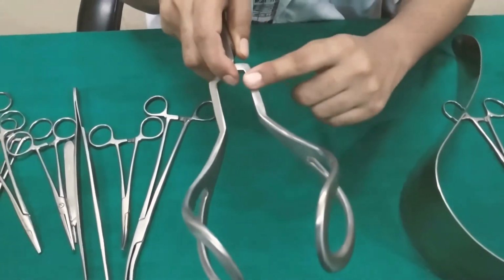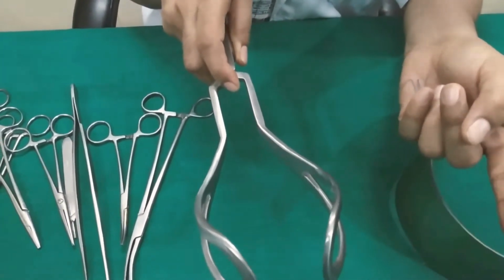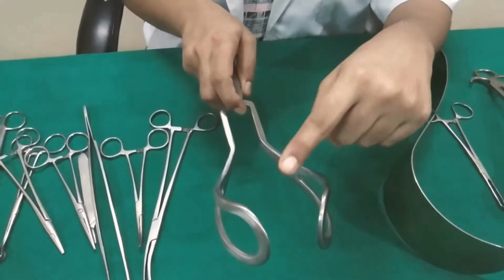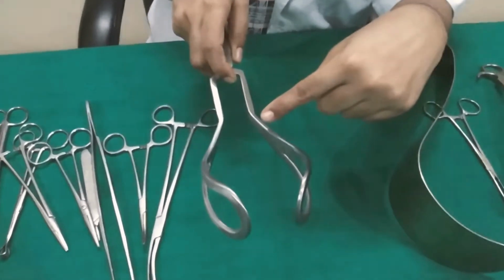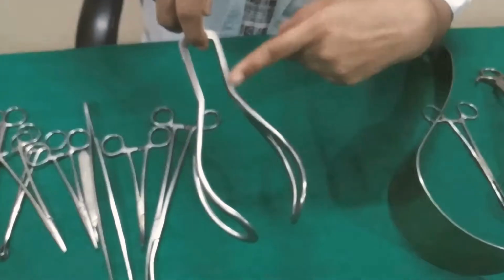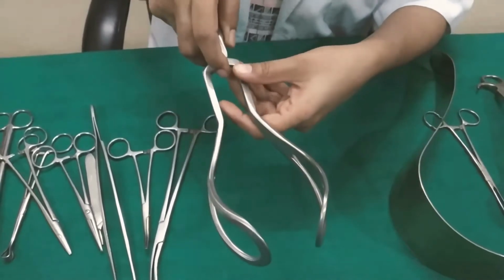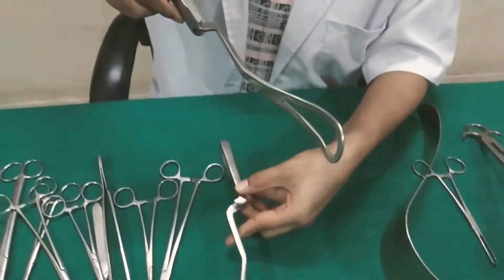The direction of pull usually corresponds to the axis of the birth canal. So the pull is downward. The direction of pull is downward and backward until the head comes to the perineum. Then the direction of pull is horizontal, straight toward the operator, and then it gradually changes to upward and forward towards the mother's abdomen to deliver the head by extension. Then the blades are removed one after the other, and we have to remove the right blade first.